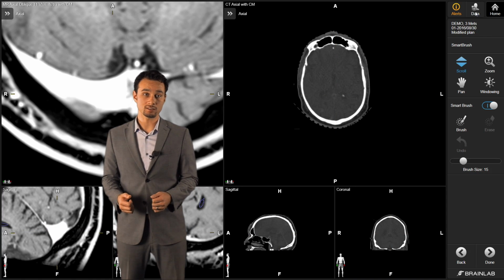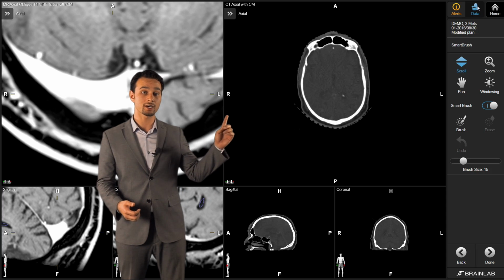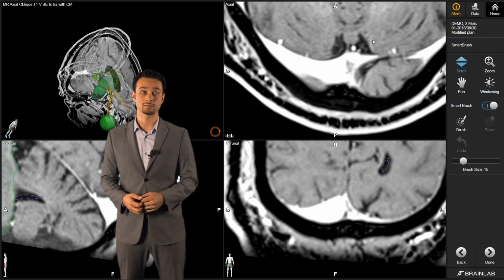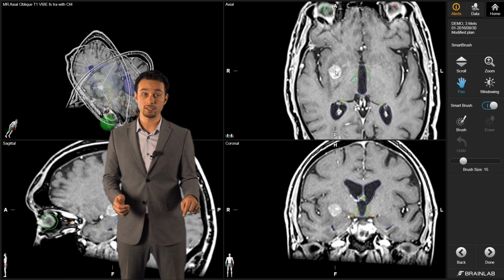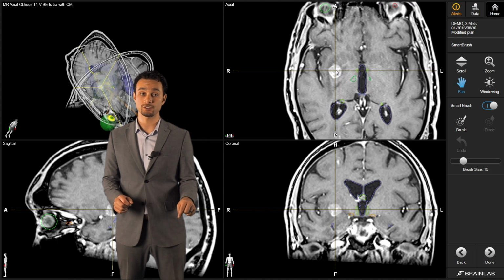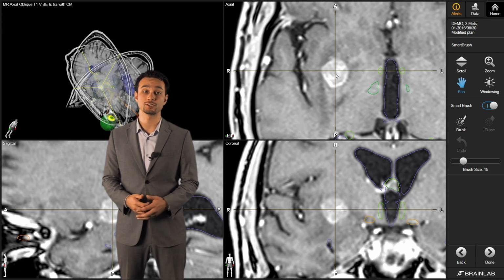After utilizing this software thoroughly, I like to start in the ACS view that you can find by clicking on the Data tab and then the first visualization, ACS. Here, I'm going to scroll through the data set to find our first target. Again, if we hold down the Control key and click, you're going to pan in all views to that location. And if you hold the Control key and scroll your mouse wheel, you'll be able to zoom in.